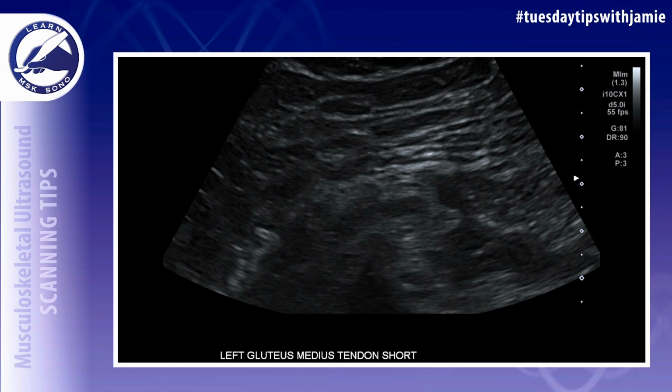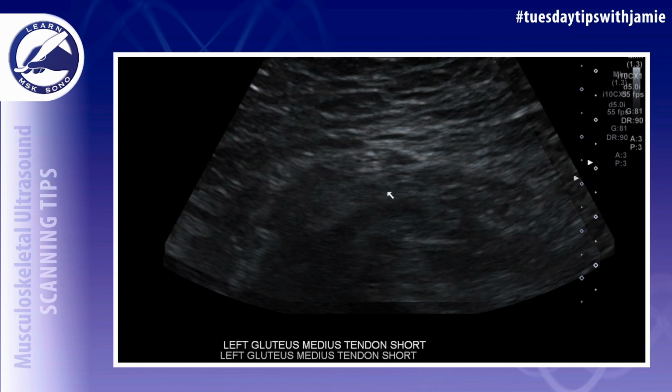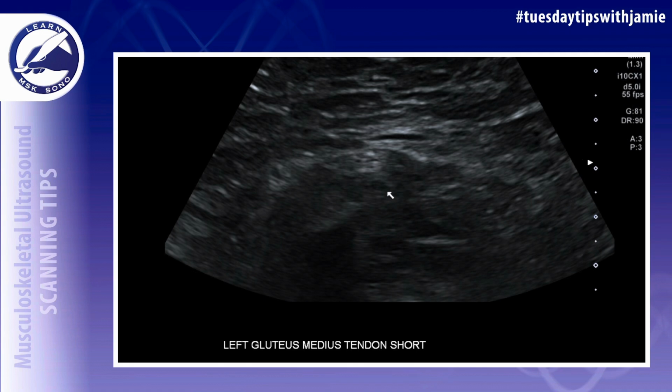These pathologies are both common causes of lateral hip pain. It is common for greater trochanteric bursitis and gluteal tendon pathology to coexist, but it's important to be able to differentiate these findings from each other on your MSK ultrasound exam.